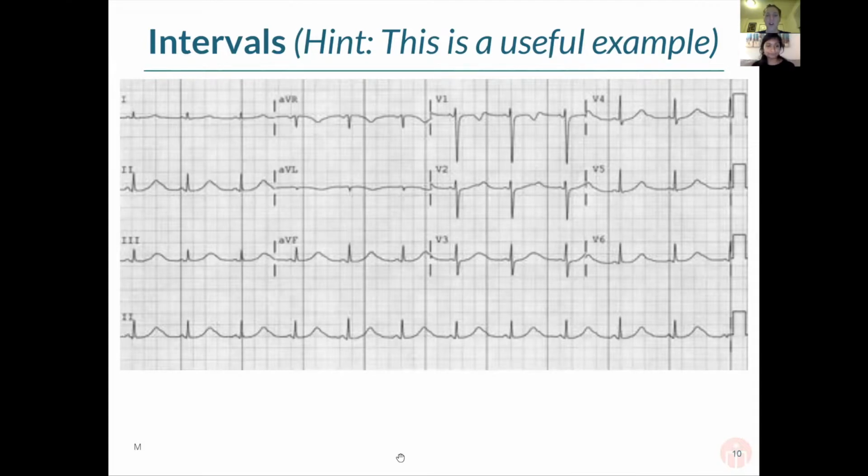Awesome. Another great trick that I use in clinical practice for a rough estimate of whether the QTC is prolonged or not is to look at the RR intervals, and if the T wave ends halfway between the two intervals, generally speaking, it's probably not super prolonged. But if we look at the bottom screen here, we can split the RR interval in half. I would say it probably ends about here. If you notice that the T wave hasn't completely finished there, it's probably just a rough estimate. Maybe it's a little bit prolonged.